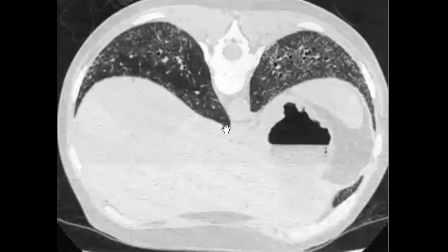They like it in the exam, in the MCQ, and everything. Picture of scleroderma, persistent interstitial changes basally in the lower lobes. So scleroderma is the best thing for this, especially with tuft resorption.